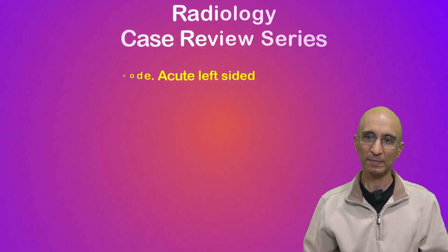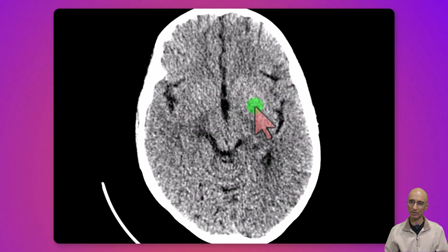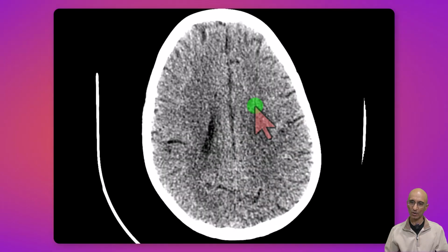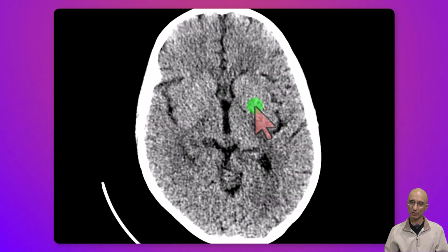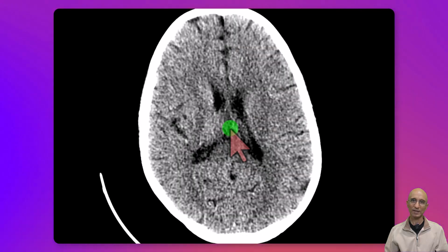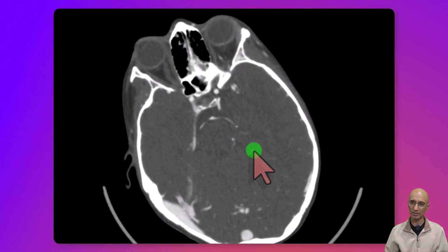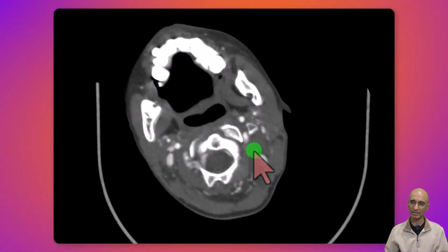Let's look at the CT head images. On the CT head images, there were no findings of acute hemorrhage or obvious mass. There were no obvious findings to suggest acute territorial infarction. The gray-white matter differentiation was preserved. Subsequently, the patient underwent CT angiogram. On the CT angiogram images, there was no evidence of large vessel occlusion, both intracranially and extracranially.